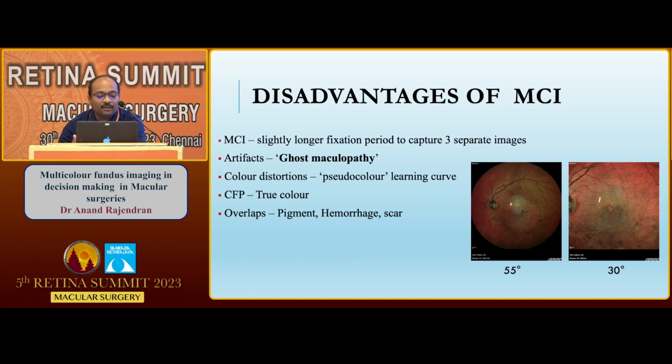It is pseudo-color, and there is a learning curve. All said and done, fundus photography is true color. That's a great advantage. And there is an overlap in the presentation of pigment, hemorrhages, and scars.